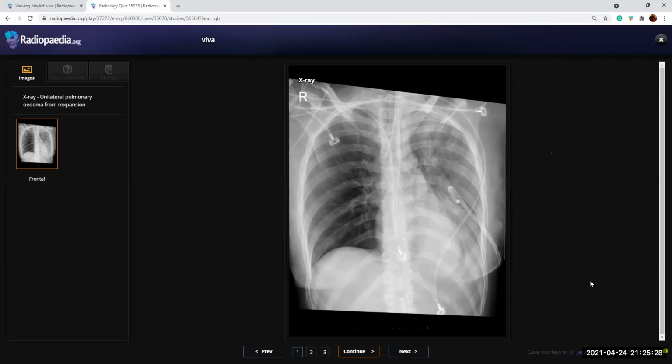These are ECG leads. There is a centrally passing nasogastric tube. Maybe it's passing through the midline and going through the left side subdiaphragmatic region. I cannot see that left side of diaphragm clearly. So I presume this patient had gone through a pleural drainage, and I'll compare the previous film if available, if this patient had a massive left pleural effusion. If so, this can be a re-expansion pulmonary edema, unilateral on the left side, and I'll compare the previous images.